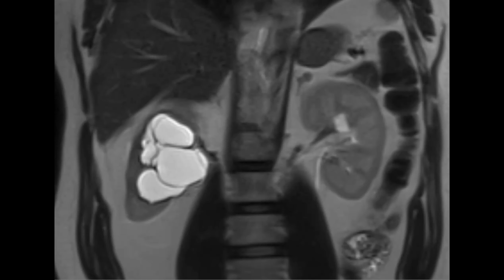Yes, agree. And that's the same kind of thinking, I think, with atypical or sclerosing hemangiomas. They are rare, but hemangiomas are so common that some of them are going to end up sclerosing over time or be a little bit atypical, et cetera. So always think about them based on their prevalence.